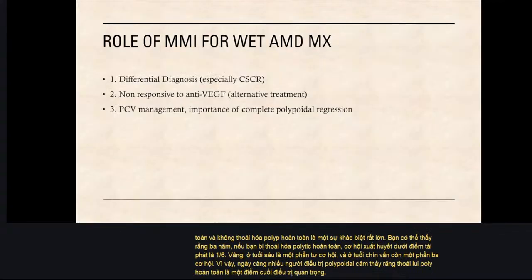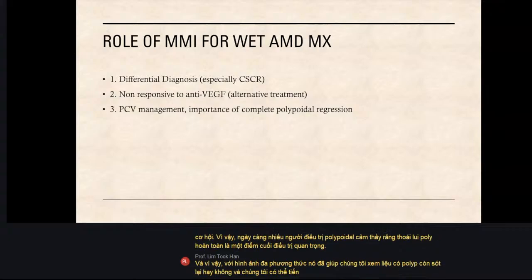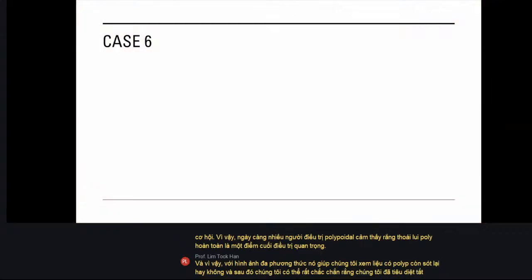And so with multimodal imaging, it helps us to see whether there are residual polyps, and we are able to then be very sure that we have destroyed all the polypoidal lesions.